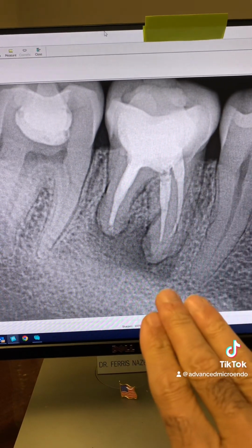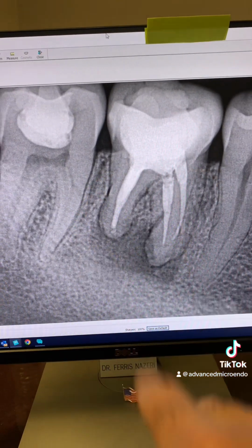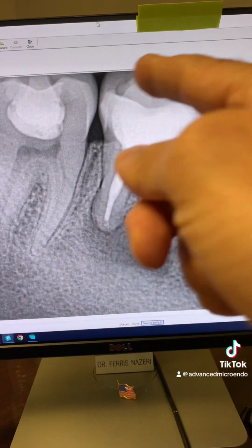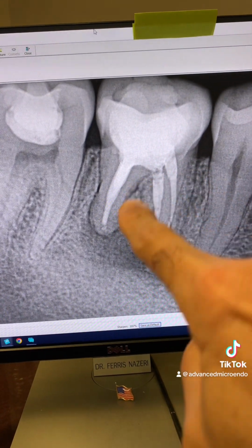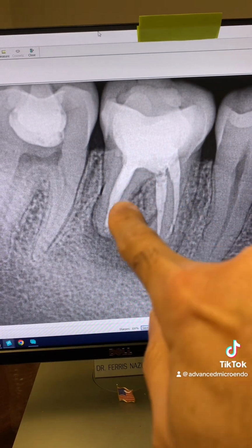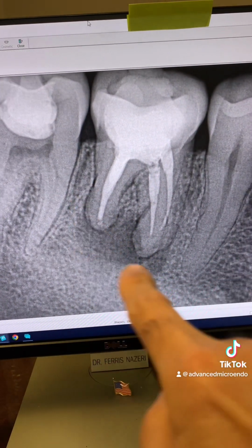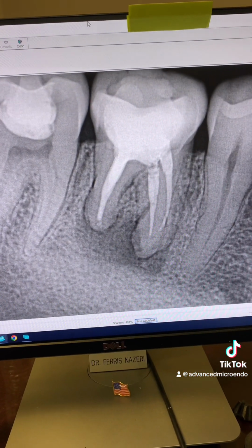So his dentist took a PA of the tooth and told him that the tooth had abscessed. So referred the patient to me. So take a look here. You can see composite buildup here, previous root canal. It looks like the dentist used Gates Glidden drills here. You can see the Coke bottle shape of the canals here, the preparation, and you can see a large periapical radiolucency.